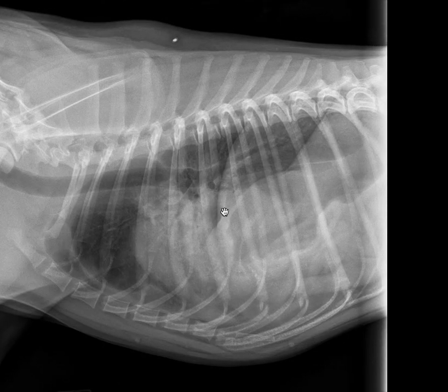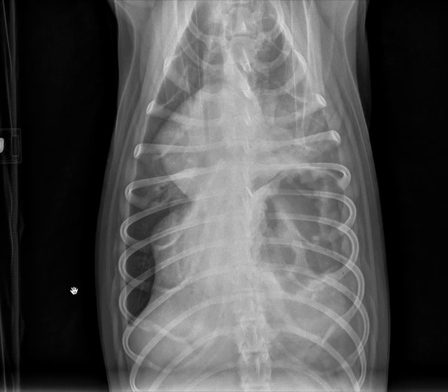One thing that I didn't mention yet is what is the status of the cranial abdominal organs that we can see? Well, we can see, of course, as we've discussed, that the stomach is displaced cranially, but I think that the status of the liver and the spleen should remain open. We don't really have enough on these views to determine whether they could be partially involved with the diaphragmatic hernia. So be sure to review the full report associated with this case.